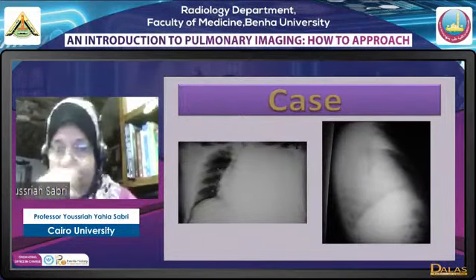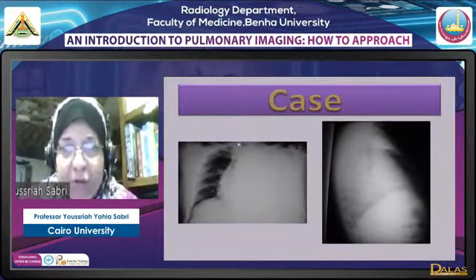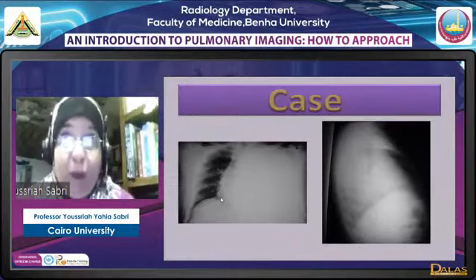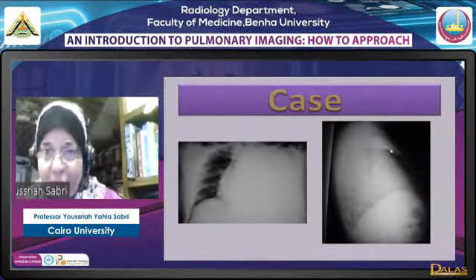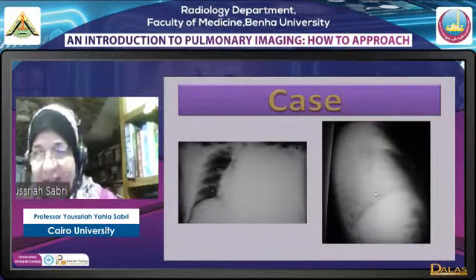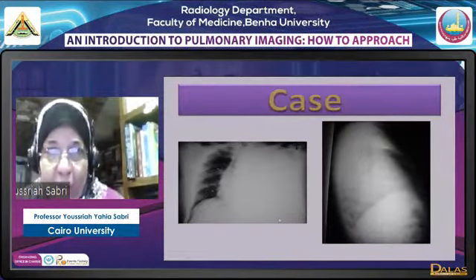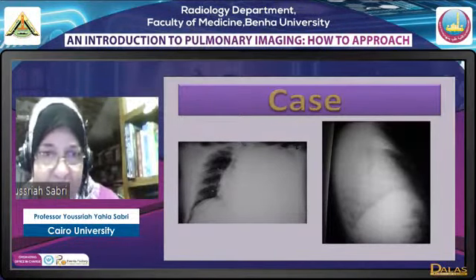very limited differential diagnosis. Now, to start with, we have total opacification of left hemithorax with contralateral mediastinal shift, a typical appearance of what? Of a massive effusion. A very interesting finding here, if you look at this lateral film, we can see the right cupula all through, and we don't see the left cupula at all, because this opacity is left-sided, so it has obscured the left cupula. So this number 1, opaque with increased volume, is effusion, massive effusion.